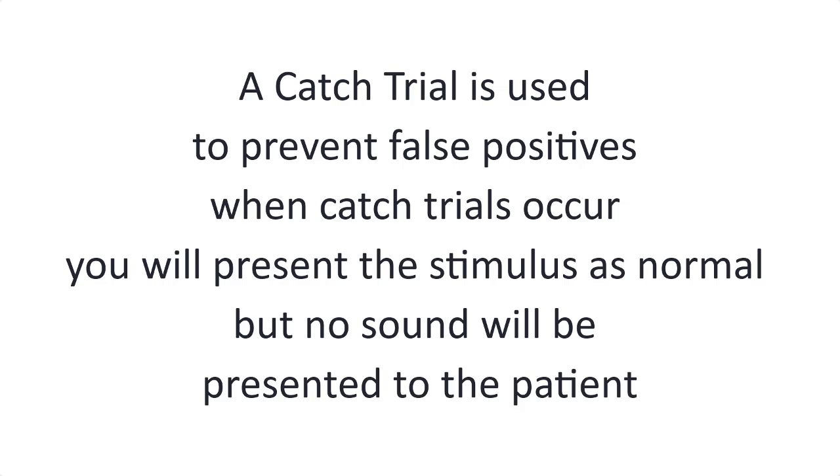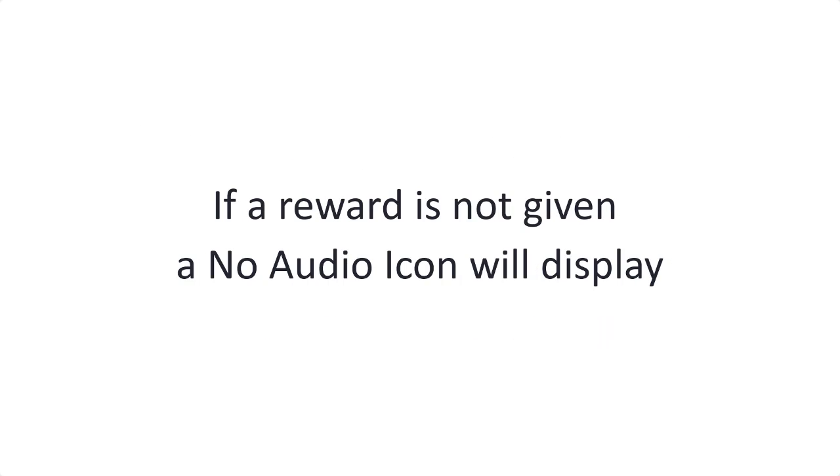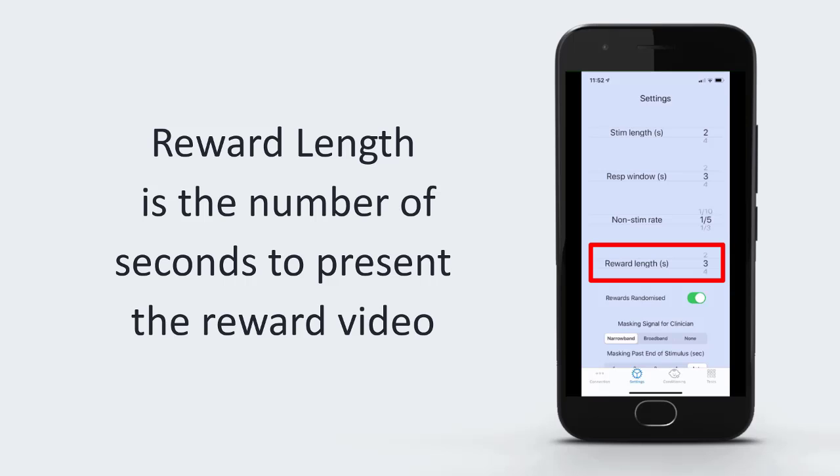A catch trial is used to prevent false positives. When catch trials occur, you will present the stimulus as normal, but no sound will be presented to the patient. If a reward is given to the patient, there will be a warning sign that displays under the presentation level, and the reward will not play. If a reward is not given, a no audio icon will display. Reward length is the number of seconds to present the reward video.